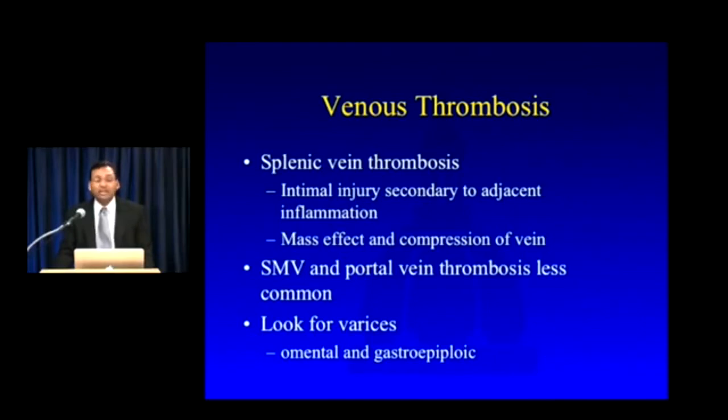You know, I actually saw a case a couple of years ago where the patient ended up bleeding out, had a huge bleed, came in from an outside hospital, and you look at this outside CT, it was a venous phase study, and I couldn't see anything. I wasn't sure why the patient was bleeding. But then we repeated the scan internally, did an arterial phase, and there was about a centimeter and a half pseudoaneurysm. It's easier than you think to miss pseudoaneurysms if you don't have good dual phase studies. So try to get both arterial and venous phase images as part of your protocols.